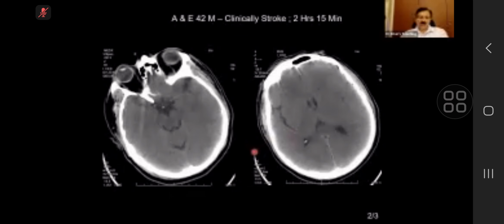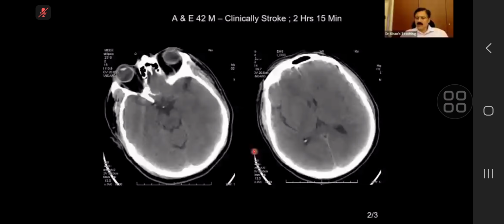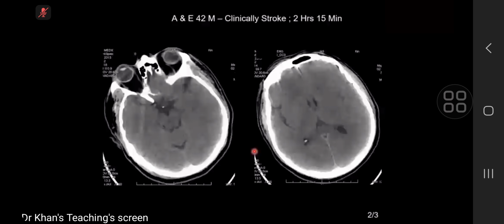In this particular case, is there an acute infarction? Now, we are going to quickly see a few cases of acute infarctions. Yes, and this is your last case, by the way. Okay. So these are 2 axial CT slices, and in the left MCA territory there's a hyperdensity, which is in keeping with a likely left MCA thrombosis.